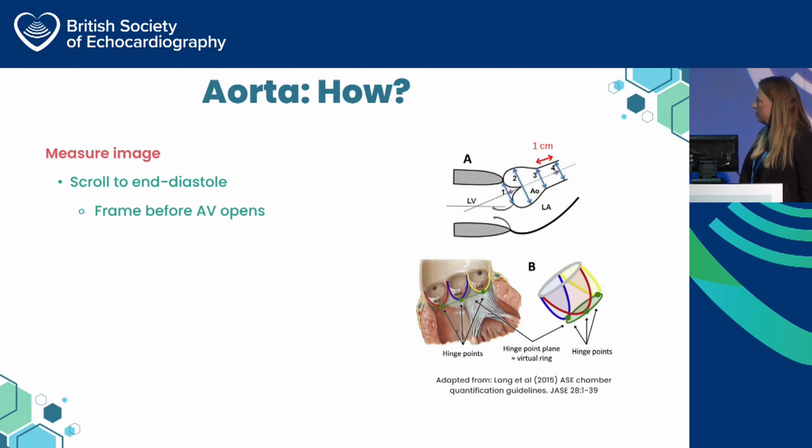The only thing that I would say about that is it depends on where the ascending aorta is dilated. I want to measure it where it's at its maximum, but if you're doing the scan after me in 6 months' time, how do you know where I made that measurement from? So what you do is you make your measurement at the widest point, and then you measure back from there to the aortic valve annulus, where number 1 was. And then you can say in your report, the widest diameter was 3 centimetres, measured 3 centimetres from the aortic annulus, and then the person after you knows exactly where it was widest.